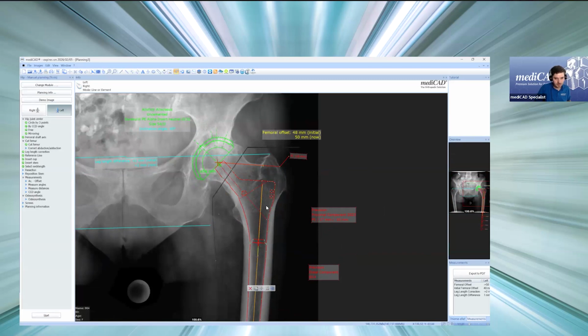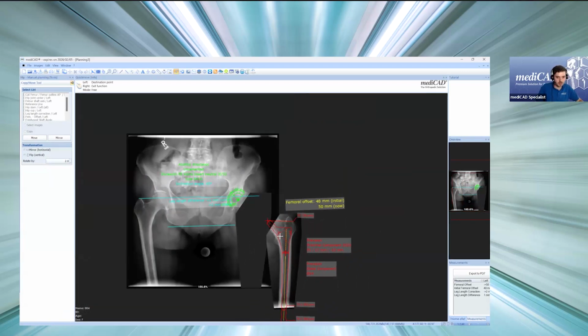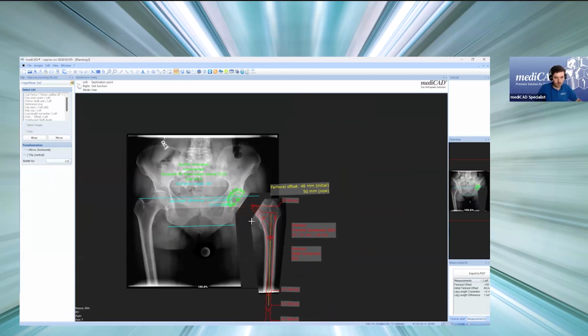So implants, measurements, as well as image parts. So if I go here, make another group, and now I select a part of the group, I can move every part around, and this group is saved for the session. So if I then want to move all the parts again, I just have to click on one of those.